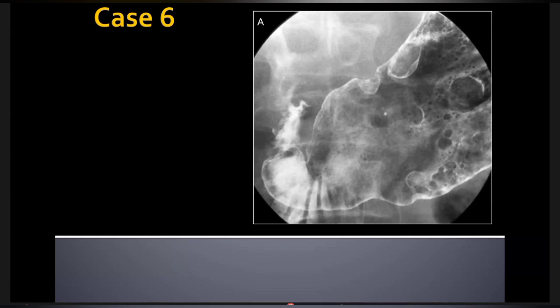Okay, right. So you think these are multiple ulcerations? Yes, ma'am. Okay, tell me, what features? Yeah, go on. But I cannot appreciate mucosal folds of the stomach in this image. The mucosal folds appear effaced to me. Good, that's a very, very good observation.